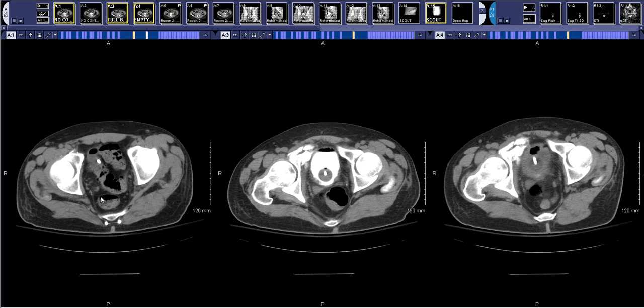These are all multiphasic studies, and uniquely we give contrast via the Foley catheter in place rather than intravenously. I'll note though that usually in these cases the Foley catheter is in place prior to coming down to radiology. Usually we will have the urologist or clinical team put in the Foley catheter, and then we merely just put the contrast in via gravity drip.